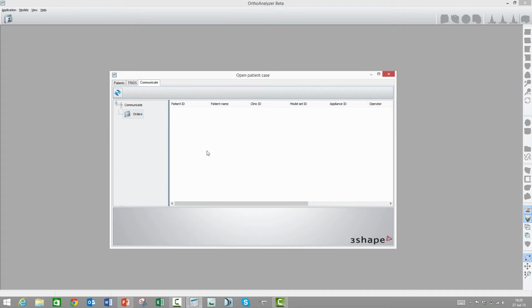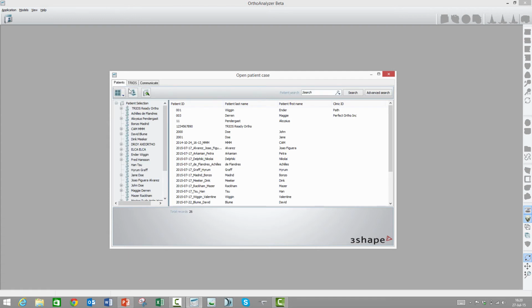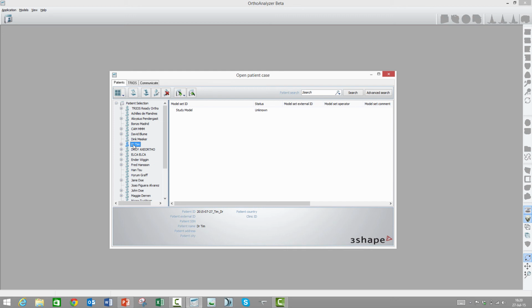So now this order has left my Communicate tab and it has gone into the patient browser. So when I go to the patient tab here and click Search again to do a refresh, I'll actually see there's a new patient called Dr. Tim here. And that's it.